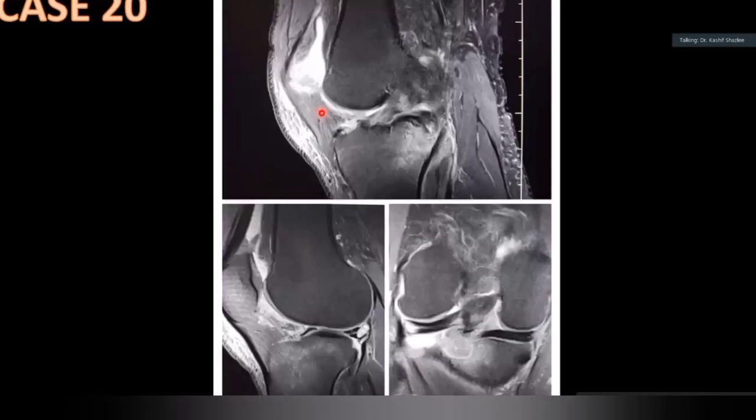In case of trauma, you can see here blurring of margins, abnormal signal intensity, abnormal orientation of ACL, so almost complete tear of ACL, significant subarticular edema. And radial tear in the lateral meniscus, and a parameniscal cyst, and joint.